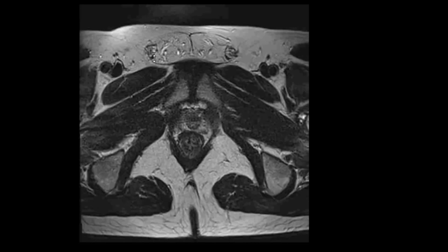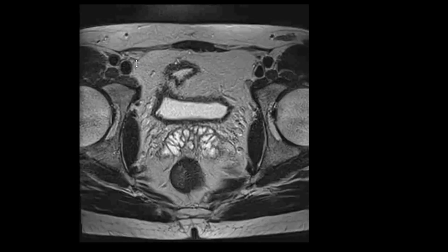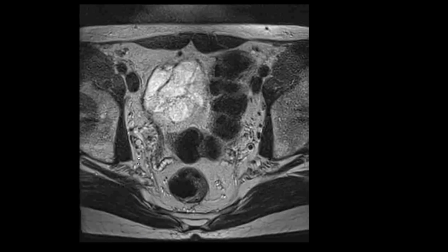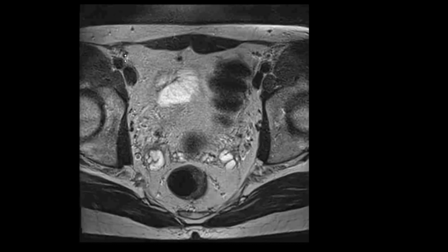It's going to travel up in the inguinal canal to enter the pelvis. And then from here, it should go up and swing posteriorly to go and connect to the region of the seminal vesicles here. The problem is this MRI did not go far enough up to see it in the axial plane. Here's the vas deferens posteriorly, but you can't see it connecting here.